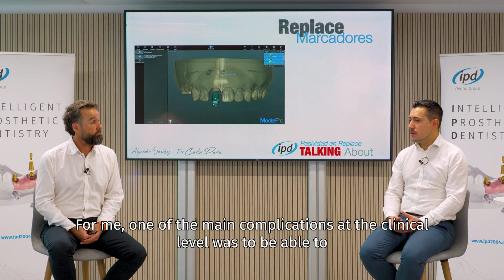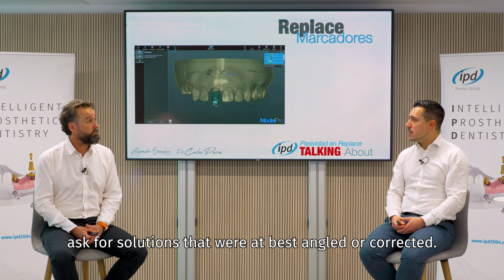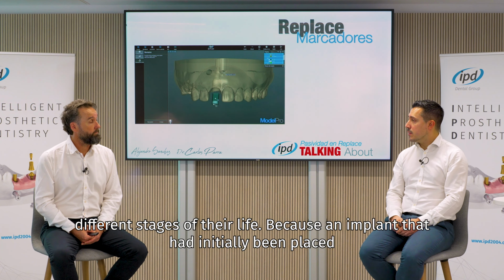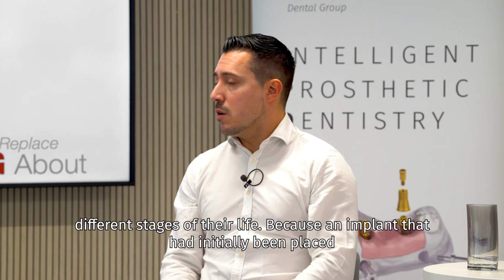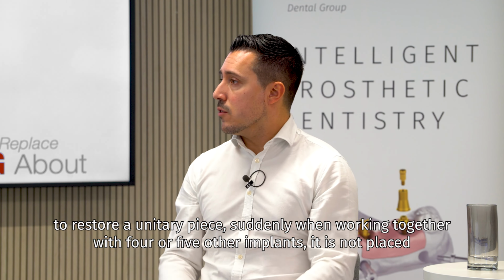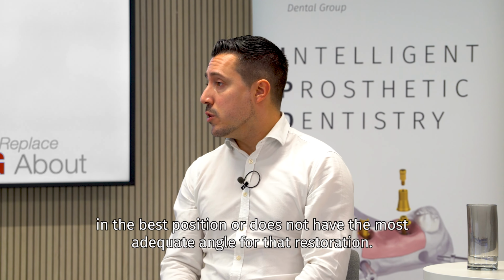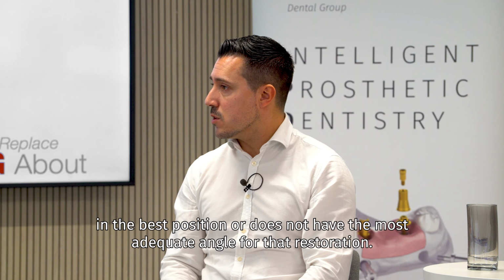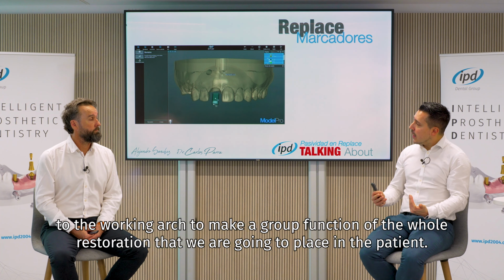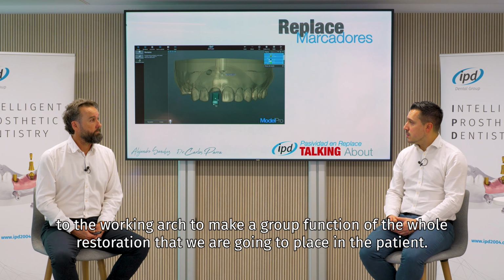For me, one of the main complications at the clinical level was to be able to ask for solutions that were at best angled or corrected. So that's what we were talking about, too many confrontations of implants at different stages of their life. Because an implant that had initially been placed to restore a single piece, suddenly when working together with 4 or 5 other implants, is not placed in the best position or does not have the most adequate angle for that restoration. For me, it was essential that you could correct that type of angulation, take it to the working arch to make a group function of the whole restoration that we are going to place in the patient.